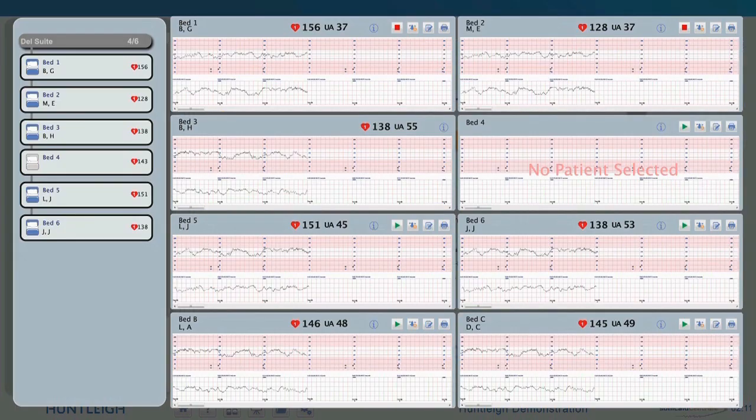Mothers' names can also be anonymized, or just patient selected, and this setting allocated to a user or workstation. This can be important to maintain confidentiality if the system is viewed in a public area. Here we are showing the patient's initials.